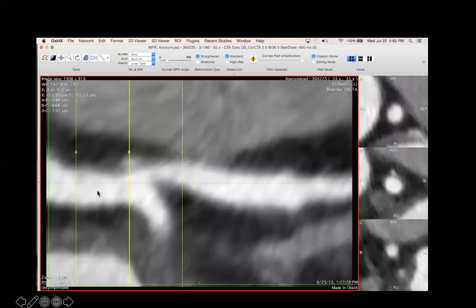We have dissected away the overlying tissue. So this is a curved path segmentation through the vessel itself. And you can see in doing that, in constructing that curved path, we have interpolated data from voxels in different places, and we've provided some kind of correlation, which looks like somebody took a paintbrush and kind of blurred it in this direction.